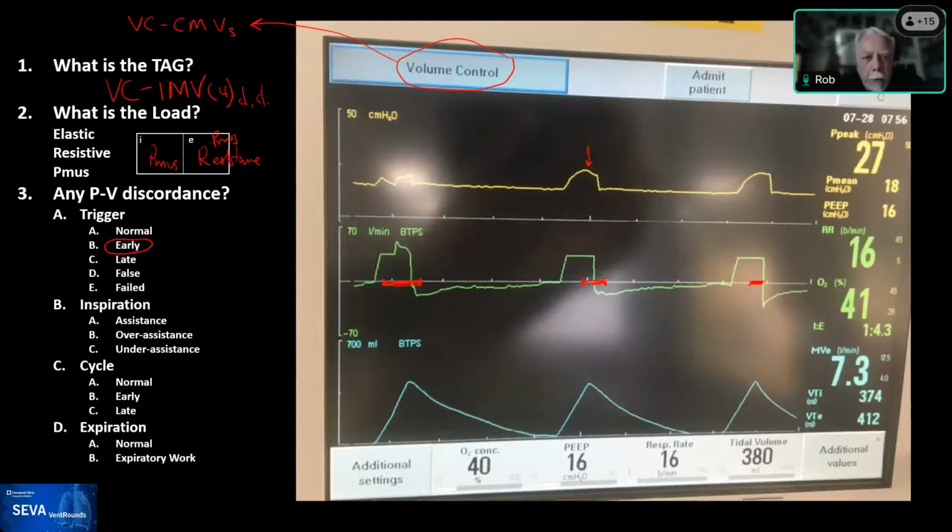Yeah, what you're saying, Ariel, is that on this ventilator, you can set the rise time for both pressure and flow. The rise time is set in milliseconds. In this one, if it was 0, it would be perpendicular, like Ari just said. So it's probably set by default to be like 0.1 or 0.2 seconds, and therefore you don't see that.